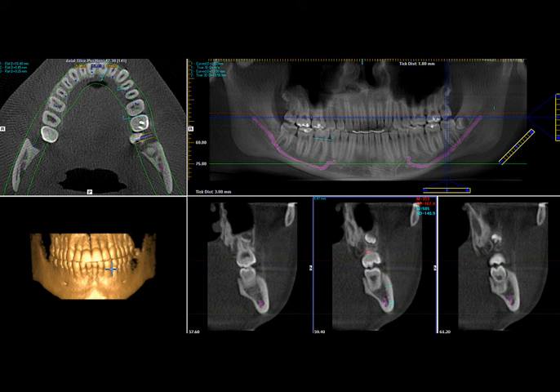Okay, so as we go on, we'll use these CT scans to go over a lot of different aspects in implant dentistry, with anatomy, surgical technique, and even occlusion sometimes. So these rules are going to come up over and over again. And the key thing I wanted you to get out of it, beside the basic information, is just to try to understand the CT scan. So now, when we're going to talk about CT scan, and I'll bring this picture up again, I don't want you to be a deer in the headlights.